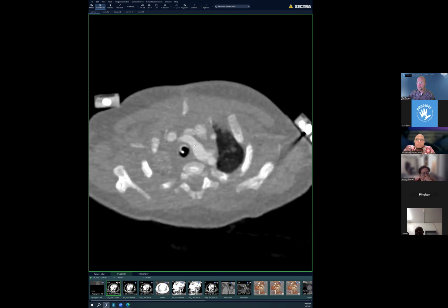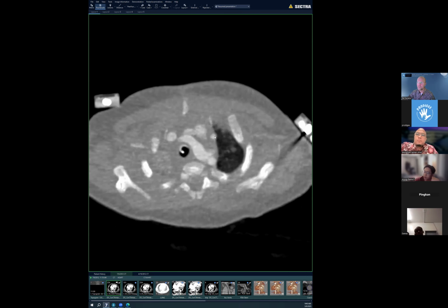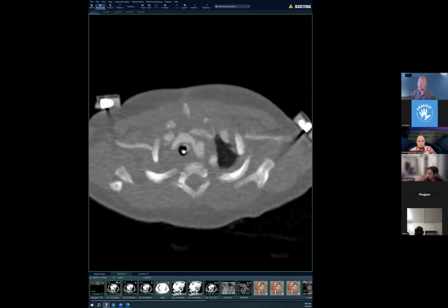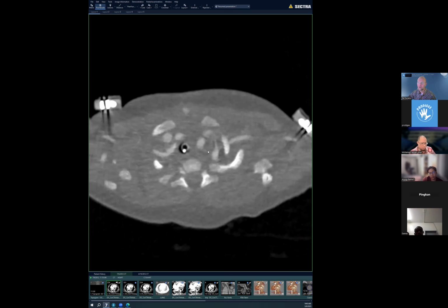We're going to follow the aorta. Now we have an aortic arch that's obviously fed by this ductus arteriosus, which also happens to have a stent. That's one part of the hybrid procedure. The hybrid procedure is called hybrid because it's done by cardiothoracic surgeons and interventional cardiologists in a hybrid fashion. There is endovascular and surgical intervention both. So this stented PDA is what is responsible for the development of the arch. And it seems like it's a left-sided arch with normal branching pattern.